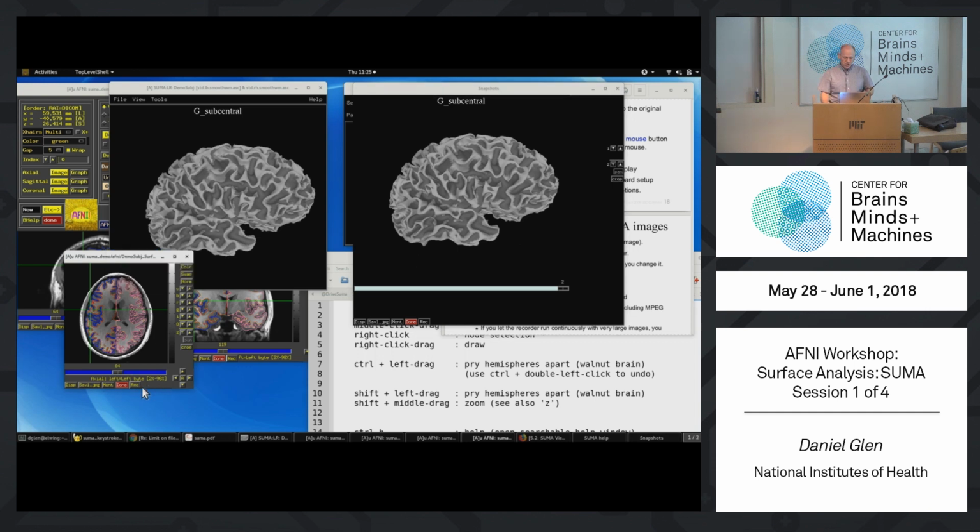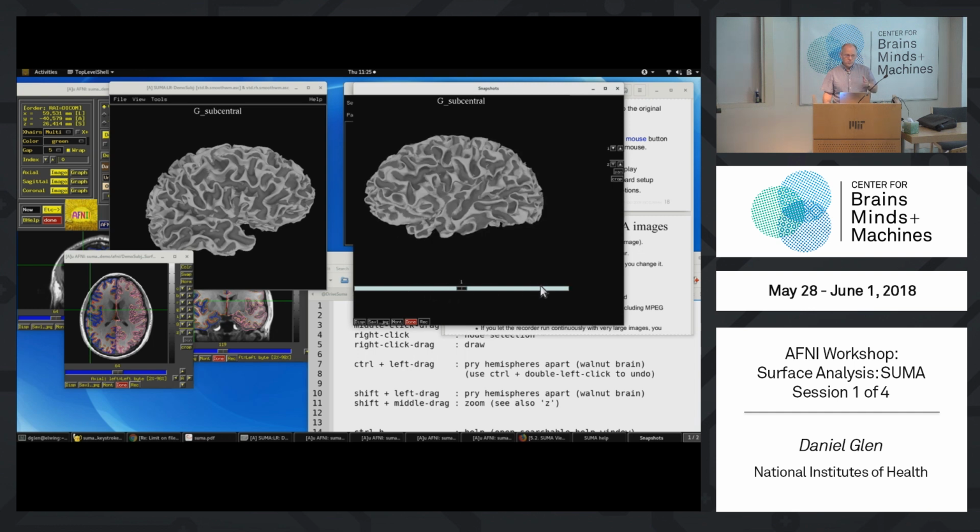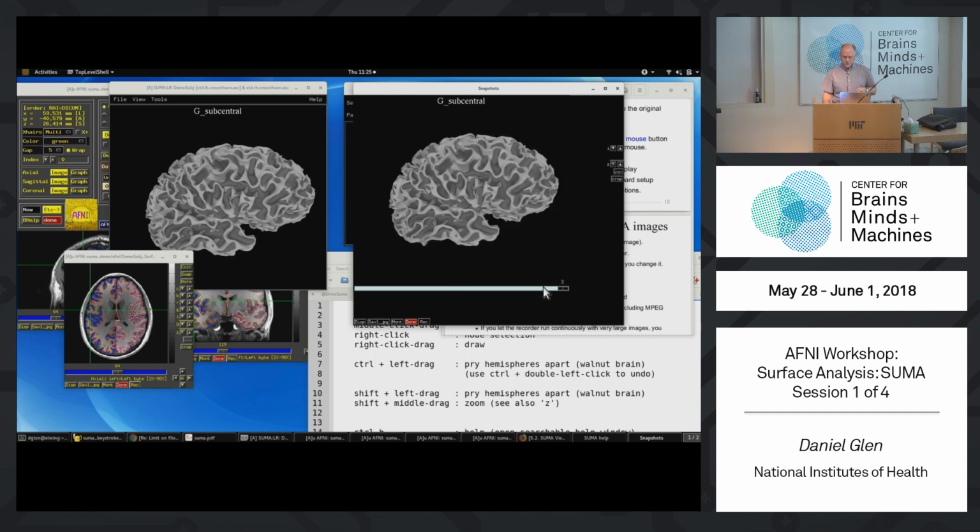We didn't talk about it here, but this has a record button. This opens up the same kind of viewer. And you can see this lets you go through your recording. So just before the class, I was recording something for tomorrow's class, something that takes a little bit longer to generate, and you can look at it.